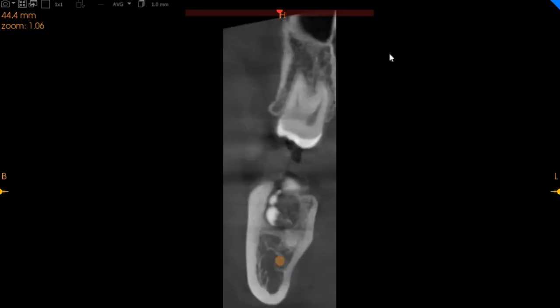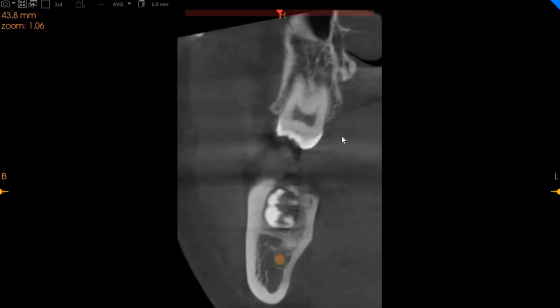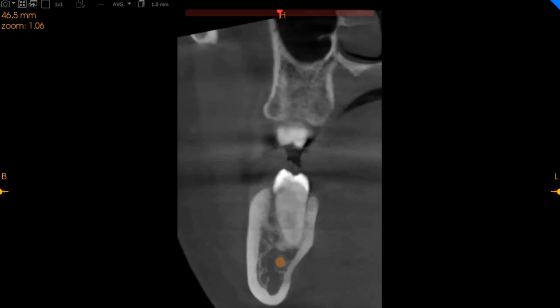As you can very clearly see right here, this wisdom tooth has relatively short roots, and just a few of them are non-fused, but the remaining tooth portion is very well fused, with good bone support overall and relatively away from the sinus. So that's the upper right eight.